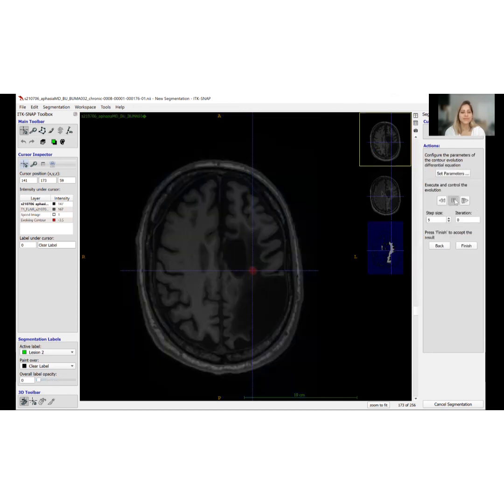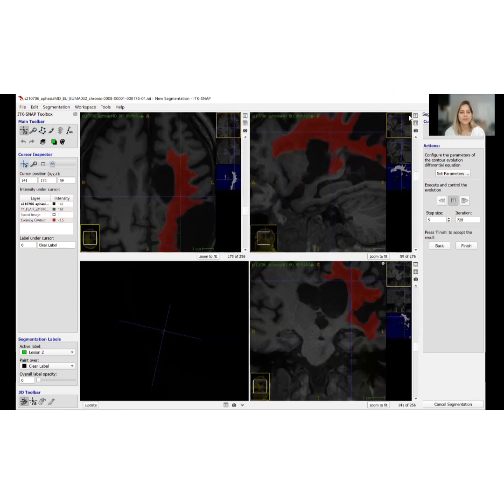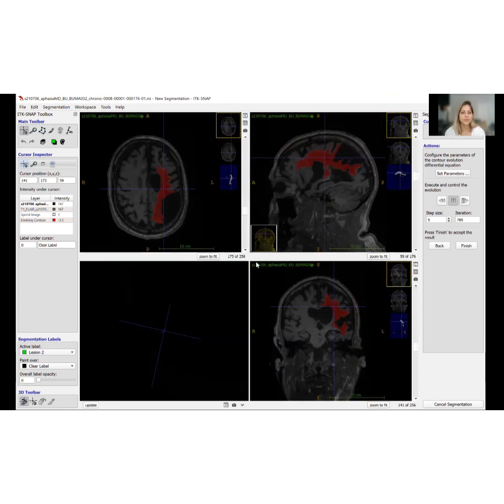So we'll try that again. And there we go. Oh, yeah. In this case, you even want to make it even slower, maybe. And we'll go ahead and look at all the views. Okay. So it seems like it's not really growing anymore. So we'll go ahead and stop it.